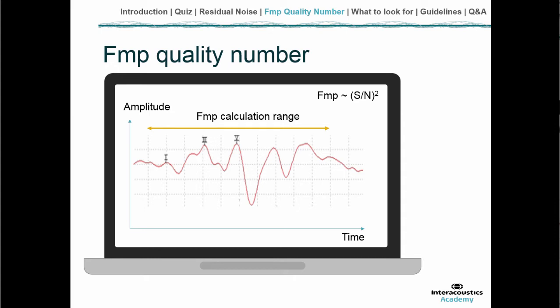So we don't look at a single peak, we do not even mind where the peaks are, we just take 10 milliseconds, and in that 10 millisecond time window we look at all the signal that is present. And what we need for that is the baseline, which is the average of the curve, and then we look at each point in the curve. How far is it away from the average? So here you see a surface that is indicating the signal.